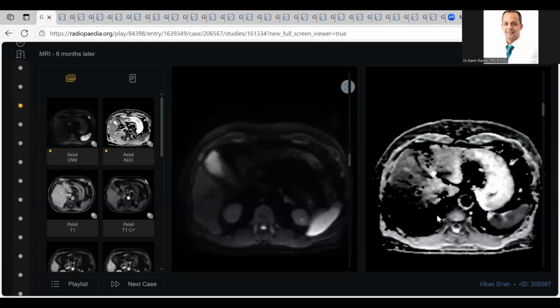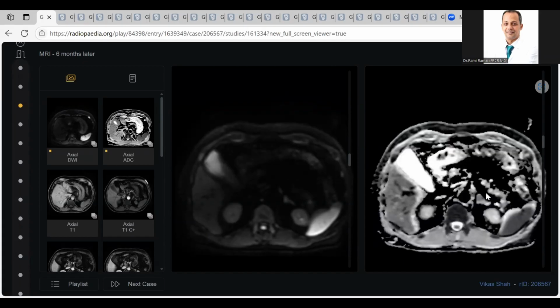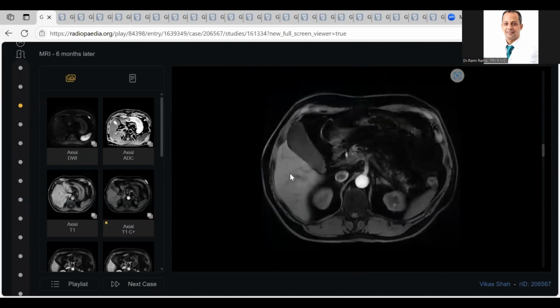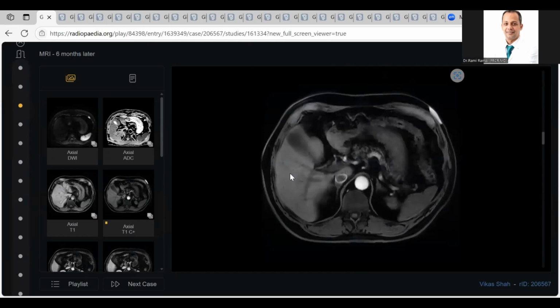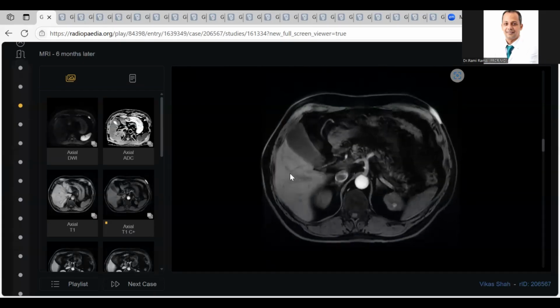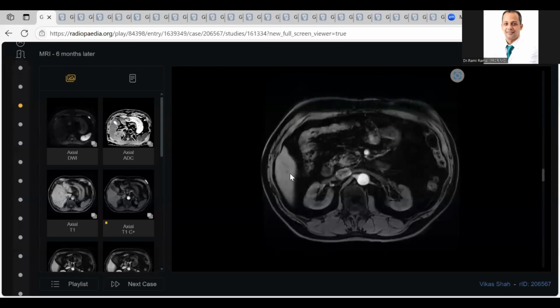Okay, here this is the tail of the pancreas. Your colleague picked up two hypervascular lesions. What is this? So, sir, it also shows restriction on DWI. So this is likely an islet cell tumor. Okay, what is this sequence? Sir, this is a post-contrast sequence, axial post-contrast T1-weighted MRI. Excellent. What happened? Sir, this lesion shows avid post-contrast enhancement.